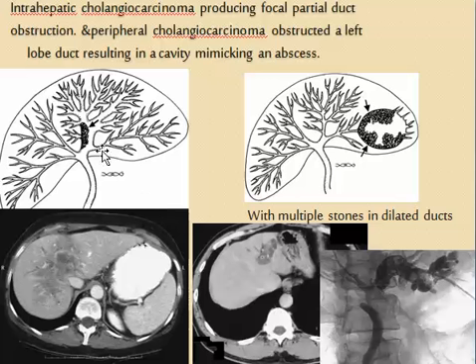And in this one, we have the tumor within the left main, right main duct with obstruction and dilatation of these biliary radicals, and of course a heterogeneous mass at the region. Cholangiocarcinoma with dilated biliary radicals, cholangiocarcinoma with abscess formation.